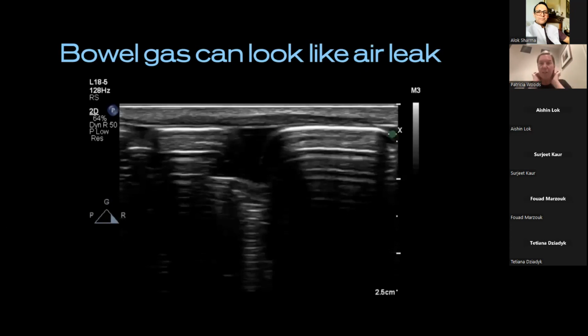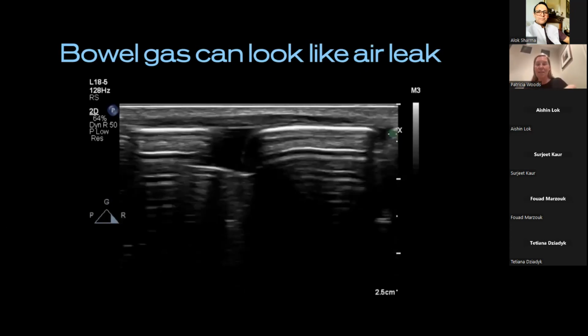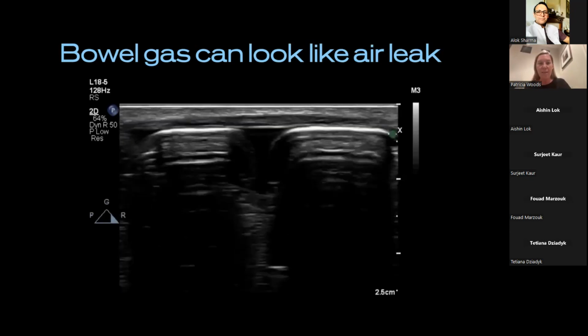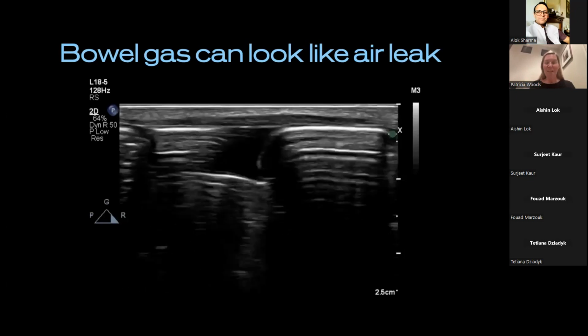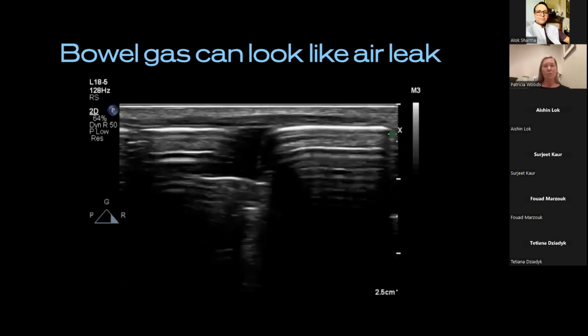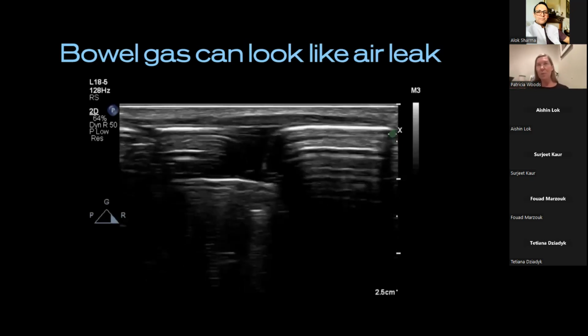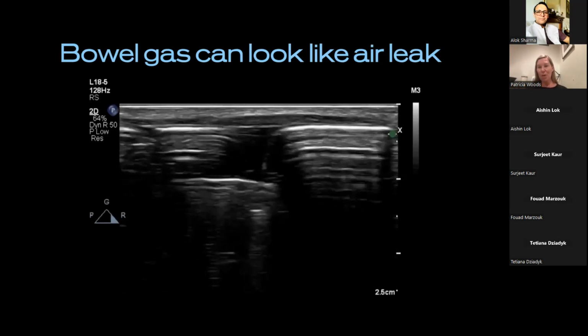Okay, so you can get caught out, like I said, when there's respiratory embarrassment, it's coming up high, it's coming up into a zone you don't expect it, or you've got surprise congenital diaphragm, anything like that. But I've seen people report false lung point and getting us horribly down that rabbit hole. It's just because of the region. Could this be stomach getting in the way?